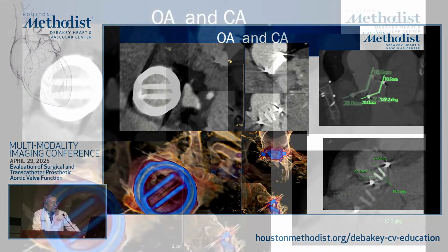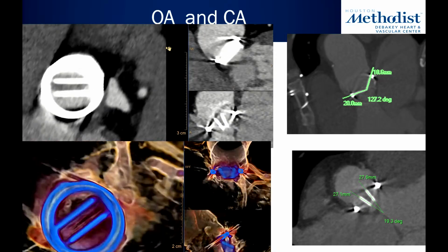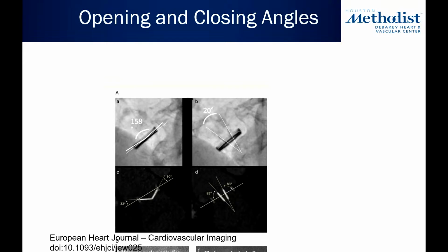Again, Dr. Zoghbi already talked about this. I'm not going to go over it again, just really emphasize that opening angle and closing angle can be performed with non-contrast gated cardiac CT. Okay, so this is the opening and closing angle. There are two ways of measuring it.